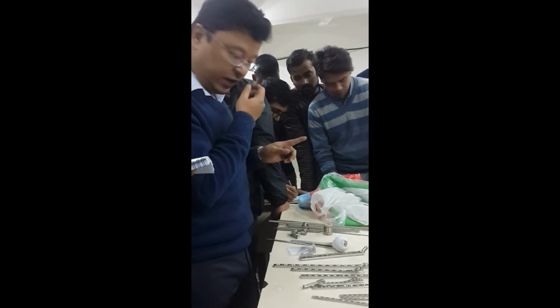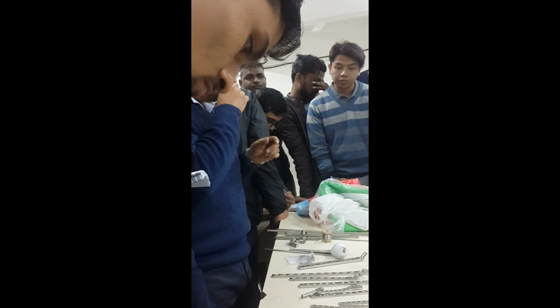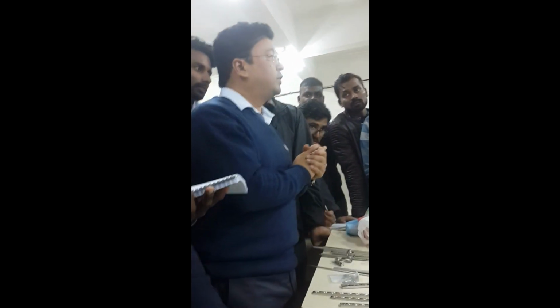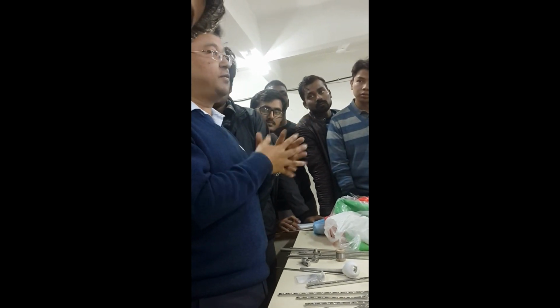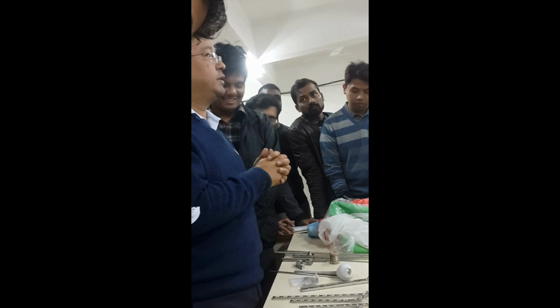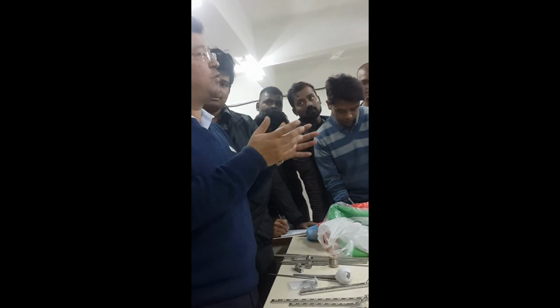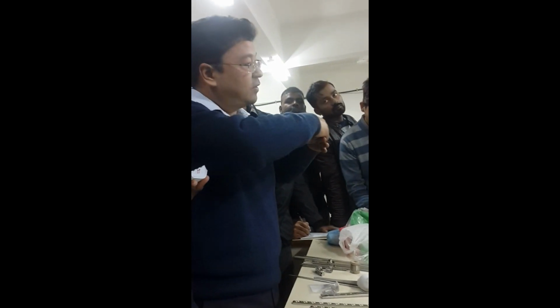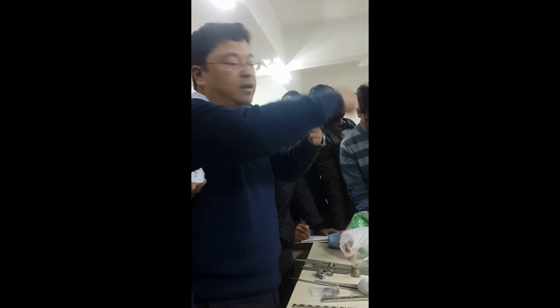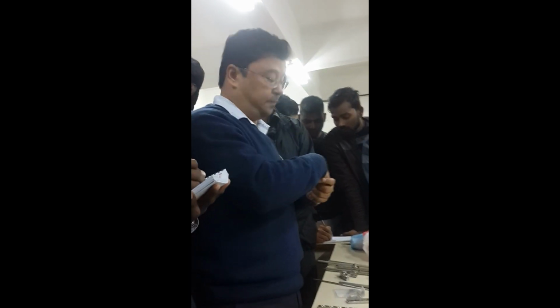And what is the other type of traction you know? Skin traction. Okay. And how much weight to keep? Usually for skeletal traction it is one-tenth of the body weight. And for skin traction, half of that. But in skin traction, you cannot put more than about 3 to 5 kgs, because it is just held by the grip bandage on the skin.